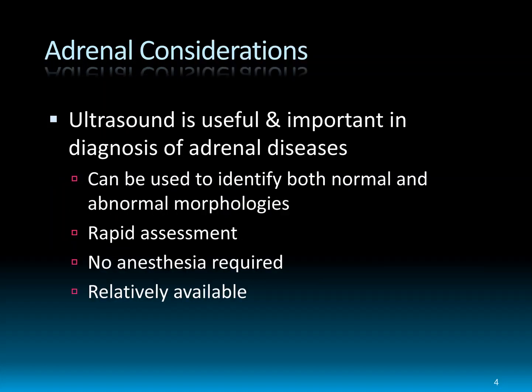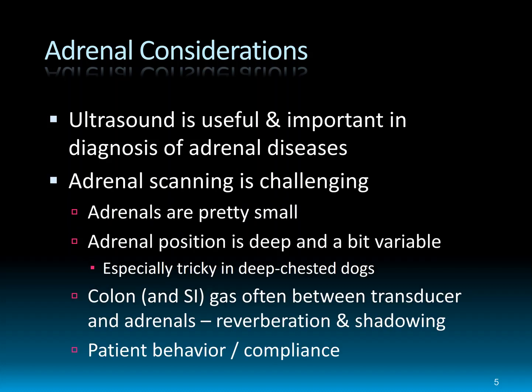ultrasound. So when we're looking at adrenal glands and looking for adrenal glands, we're doing that because we want to be able to identify both normal and abnormal morphologies. So ultrasound is really good for doing that because most of the time we can find the adrenal glands and be able to assess them. It's pretty quick to do. Usually you don't need anesthesia. Occasionally you'll need sedation for a patient, but often not, and ultrasound is these days relatively available. So it's a good test to use when you want to assess the adrenal glands.